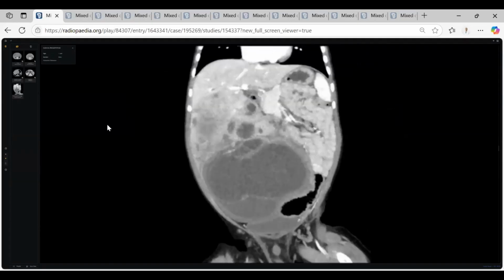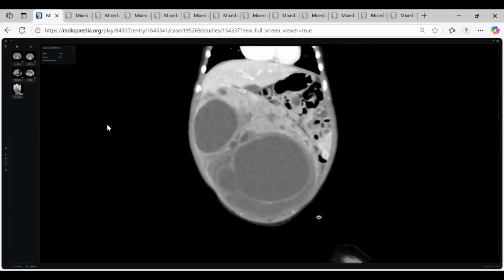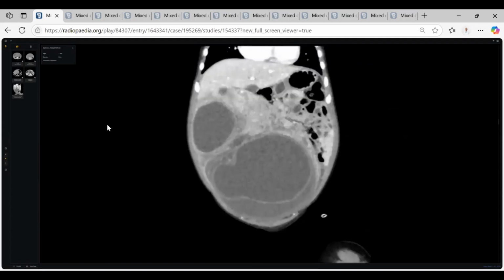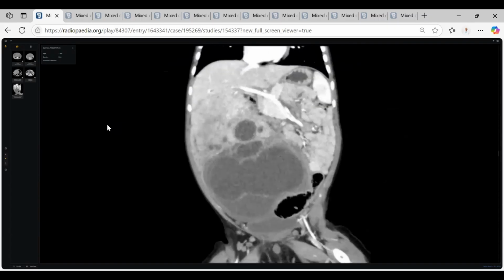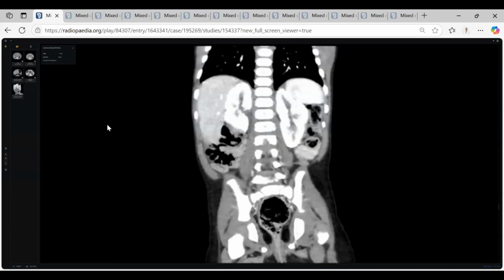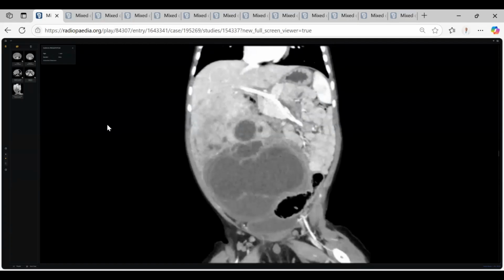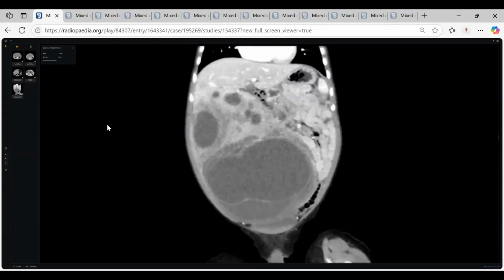No, this is not the liver. There is a lesion down there seen in the right lower quadrant, heterogeneous with multiple cystic areas. Yes. What's your differential in a 1-year-old patient? The kidneys look fine. Please, go on. Yes, this is the lesion. Okay, give me a differential in 1 year.